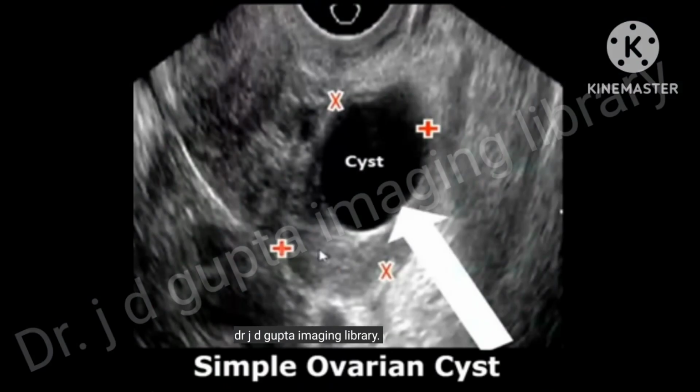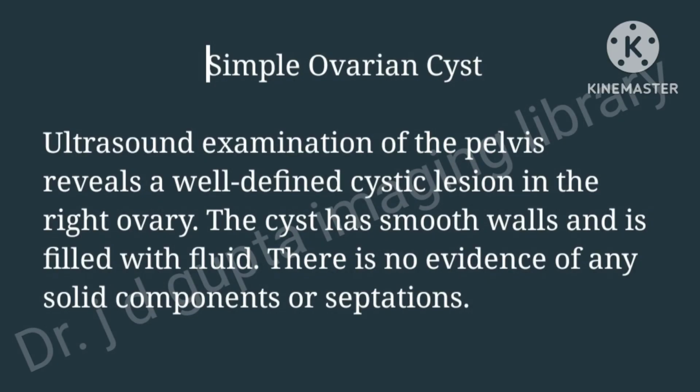Next, talk about simple ovarian cyst. Ultrasound examination of the pelvis reveals a well-defined cystic lesion in the right ovary. The cyst has smooth walls and is filled with fluid. There is no evidence of any solid components or septations.